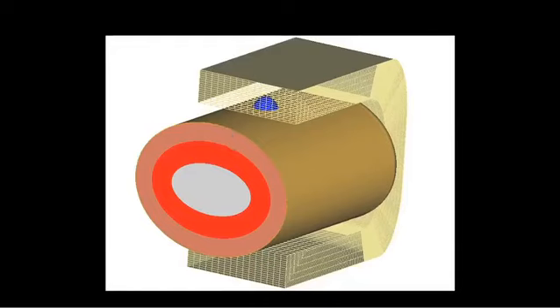dermis, musculature, and bone. And this model is integrated with a blood oxygenation sensor, including a parabolic mirror, an LED, and underneath a detector, so that we can examine the level of blood oxygenation within the dermal layer of this particular model. This is a great example of how we can create a complete virtual prototype using both a biologically relevant structure as well as realistic optics.